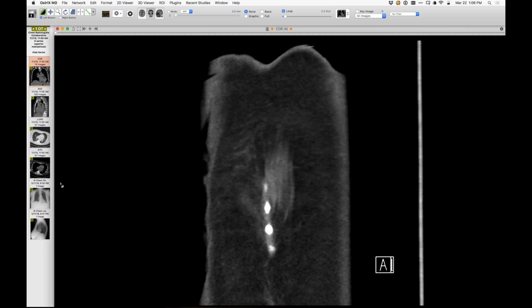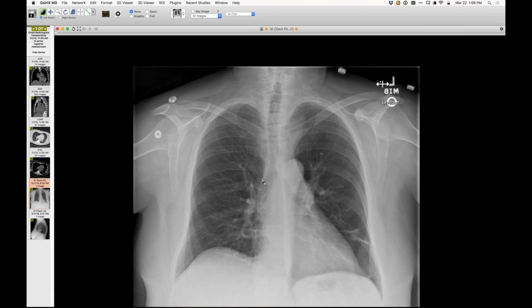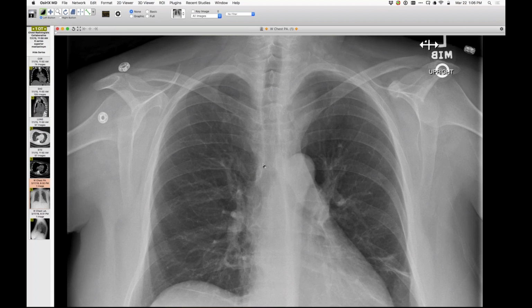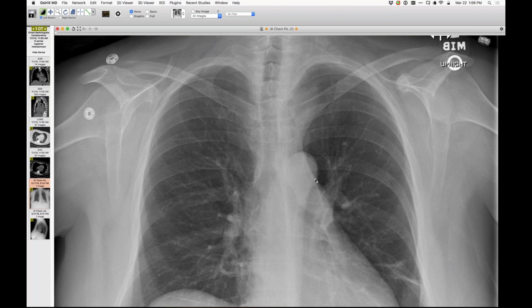This is just a nice example of anatomy. It's a classic example of a classic Benjamin Felson radiology sign. We tend not to see this, or I tend not to see this, on the right side, but this one is a left-sided one. So here is the finding. This, by the way, is normal right here. That interface is the normal so-called aortopulmonic pleural reflection, where the left upper lobe reflects over the mediastinum in that location. So that interface is normal.